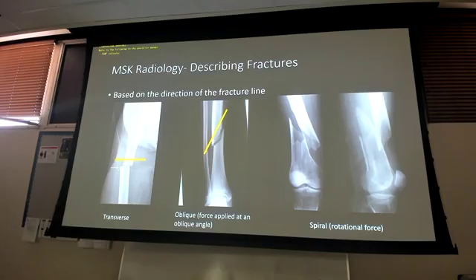Right or left femur? Do we know? Do we have enough information? I would argue we do. Because I could finish drawing this pelvis out over here, if I use my mind's eye, and know that there's still another leg sitting over here somewhere. So that's my left, so that's the patient's right femur. I have enough information to determine that it's right, because I know the anatomy, and I know where the femoral head goes, and I know where the rest of that pelvis should be. So that is a right femur. Because if I had the whole x-ray, I'd have another leg over here, because here's where my femoral head goes in.